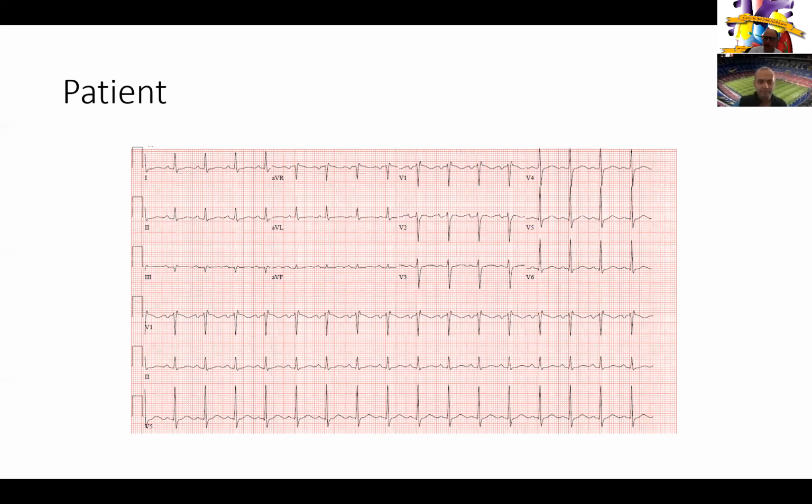So Dev, this is his EKG on presentation. Yeah, so you can see here, it's normal sinus rhythm. The things we look for when we're evaluating patients with endocarditis is we see a lot of patients with aortic root abscesses, and they develop because of where the AV node is located. A lot of them develop PR prolongation, and some of them we get concerned about heart block. As you can see here, you have a patient with normal sinus rhythm.